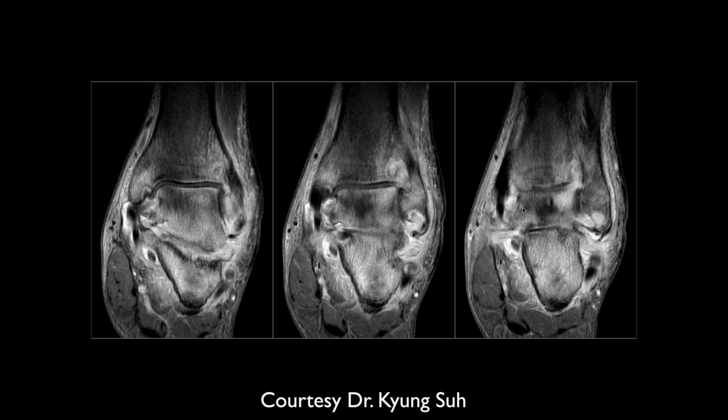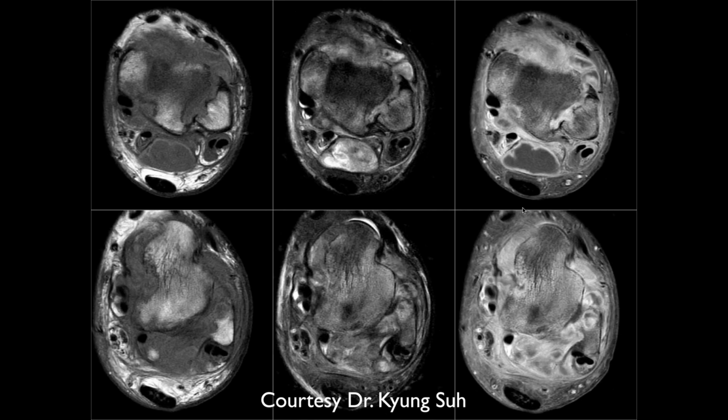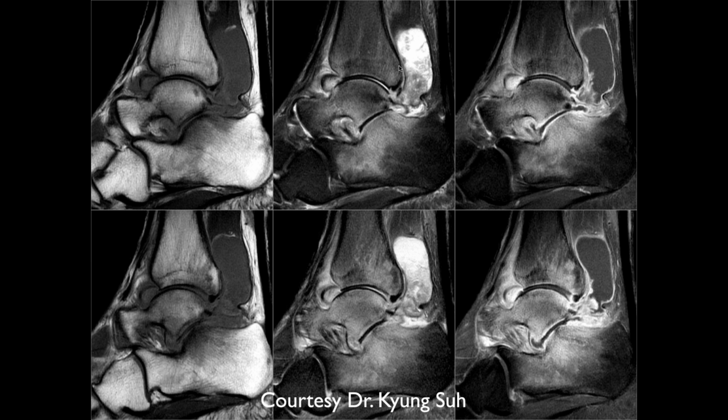I'm guessing it could be staph. Or, okay, it's TB. Well, okay. Actually, it's probably not staph. Staph would be much more destructive than this. So this is a lot of involvement.